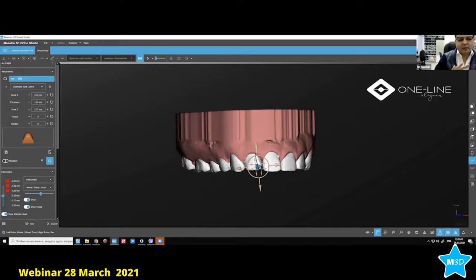So right now we are talking about rotation. For rotation, you can use optimized root control. I like these very much. I can use ellipsoid, and we can use the first attachments. Okay, so let's see if there are any others which are good enough. Okay, the square attachment is good enough. It doesn't really look good in the mouth, so I don't really use it.